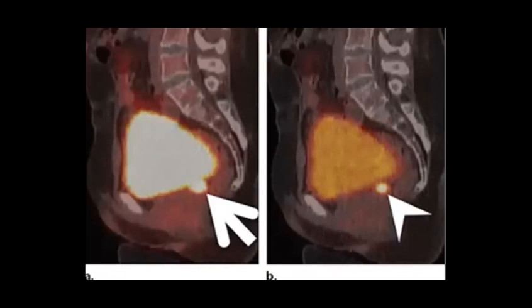Yes, sorry, yeah, let's go to this case. I have some trouble with the connection, so this patient has a history of treated sigmoid cancer, and also high tumor markers. Yeah, they measured the SUV here, and it is about 10, so it's high uptake. I mean the FDG.